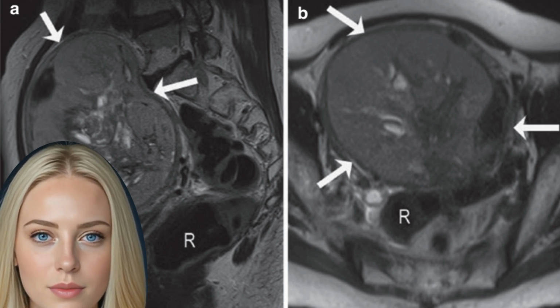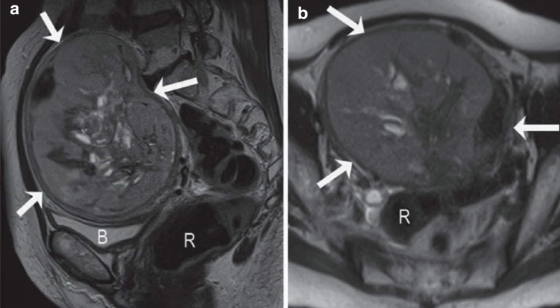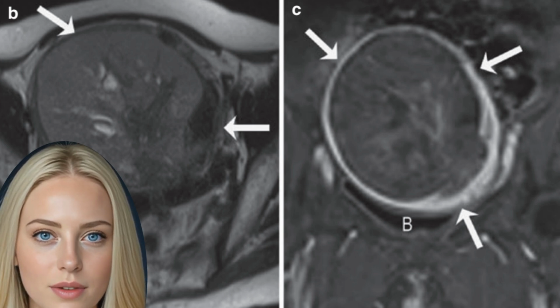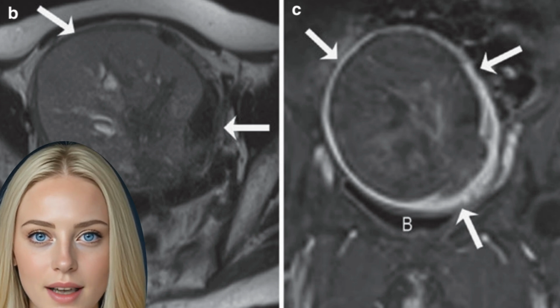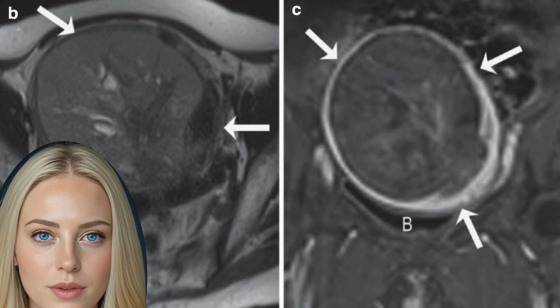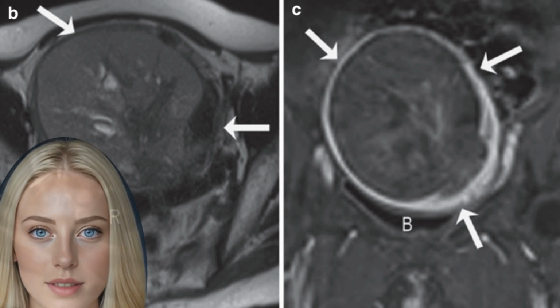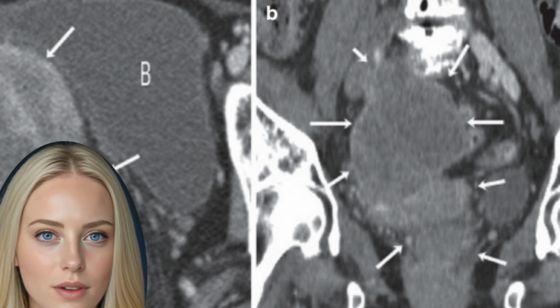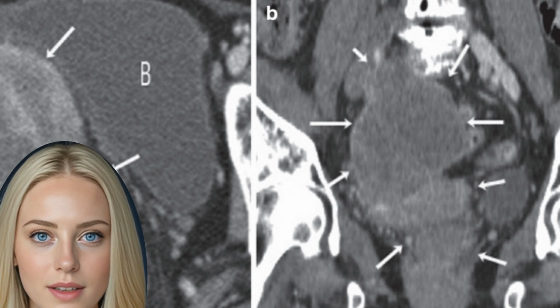On CECT, the uterus commonly presents as a heterogeneous mass with ill-defined boundaries and irregular central zones, commonly due to necrosis. The adenosarcoma is often defined as a large, multiseptated, cystic mass with heterogeneous solid components in the uterine cavity. The solid components are mostly hypointense in the native T2WI, which represent with strong contrast enhancement in CET1WI. Adenosarcoma may also present as a large polypoid mass occupying the endometrial cavity, possibly protruding into the vaginal cavity.